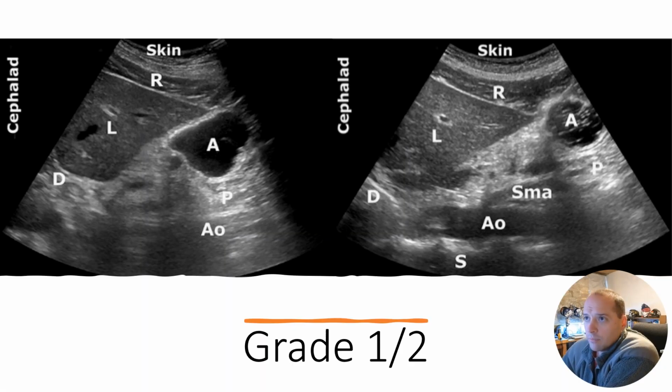Grade 1 or 2 just depends on the volume itself. Grade 1 or 2 means that there's liquid in there. You don't see any solid food, but you see liquid. A grade 1 is normal. That's just normal gastric fluid. It's less than 1.5 mLs per kilo based on the calculation in that table we looked at. Safe to proceed. Grade 2 is an actual full stomach.